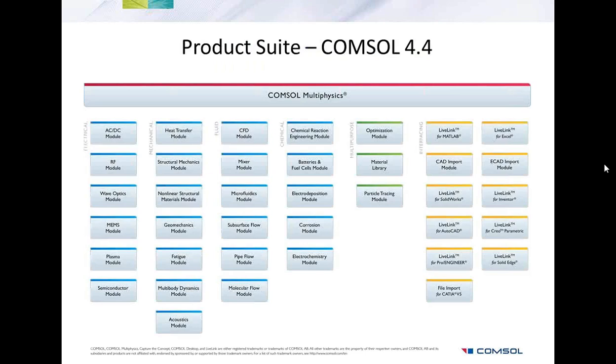The alternative is to just import your mappings, and where you've got very low or soft tissue regions, you define those as voids or extremely low Young's modulus values, so they're not actually structurally important. So you've got two methods if you're looking at patient data, or you can develop the models in 3D CAD packages and import those directly inside COMSOL.